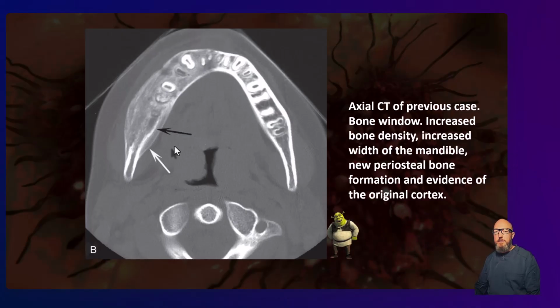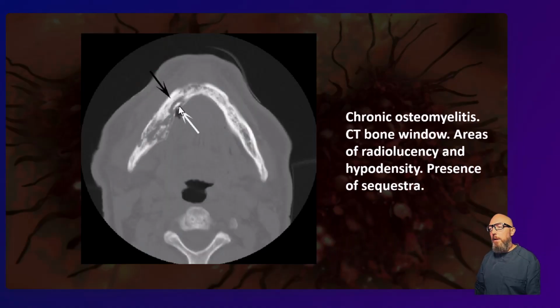Oh, there he is. Good old Shrek. All right, hallmark sign of osteomyelitis. This is a sequestrum, very dense bone. It's sclerotic around it as well, but sequestra tend to become really dense eventually. Kind of a moth-eaten, mixed, irregular appearance. So this just looks overall bad. You're thinking inflammatory, malignant, hopefully, if you've got your categories down. And could it be osteomyelitis? We'll look for those hallmark signs. And here's our sequestrum, so osteomyelitis.